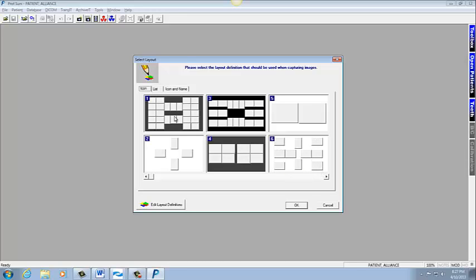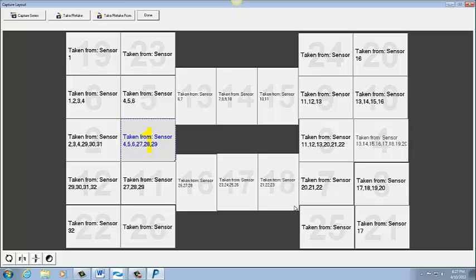Okay, so I'm just going to go ahead and click on the CMRS that we'll most likely be using, and click OK. And it's going to bring you into this view in order to take the radiographs. Now with SUNY, it is designed to go to each view for you in a certain order. So this one particularly is set up to take bite wings first.